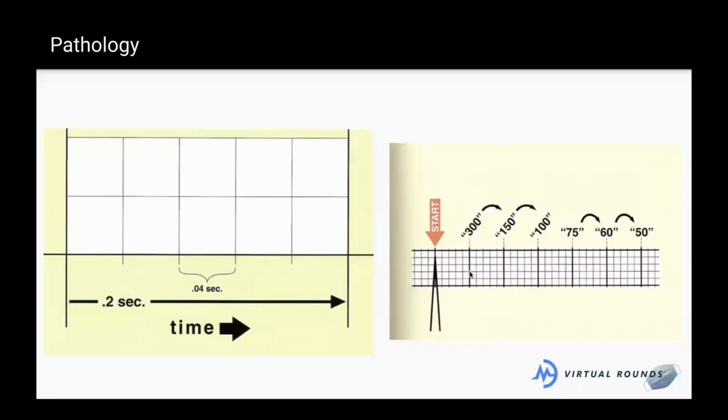The cheat method is you count the big boxes. You can see that there are thick lines and thin lines. If you count from the top of the R peak, which is the steepest peak, because remember it was Q down, R up, and then S, from peak to peak, from each QRS complex to the next, and you count one box between them, the rate is 300 beats per minute. If there are 2 big boxes between them, then it's 150 per minute.